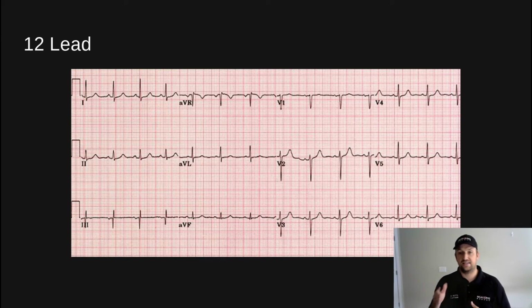Lastly, leads, I see all leads. L is lateral, V5, V6, 1, and AVL. There is no ST elevation or depression in V5, V6, 1, and AVL. Last little section I would do is look at the rate. So in this case, I already know this is within the 60 to 100 for the normal rate range. So this is a normal sinus rhythm 12 lead.